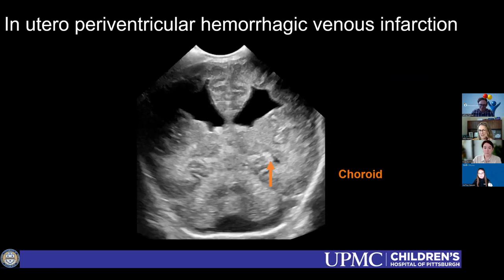Any comments about this from any of my fantastic co-moderators? Judy, I want to say I think it's really great that you brought up the choroid plexus as the internal control, because in ultrasound, hypoechoic, hyperechoic is always relevant to something. And especially my trainees and my fellows particularly freak out about hypoxic ischemic injury and white matter changes, because they're like, how bright is too bright? And it's nice to have that internal control to compare to. And so I think that's a really important point.